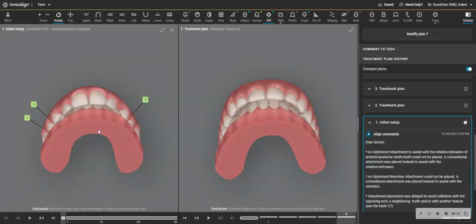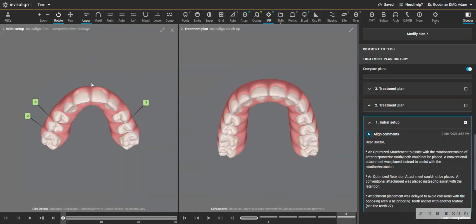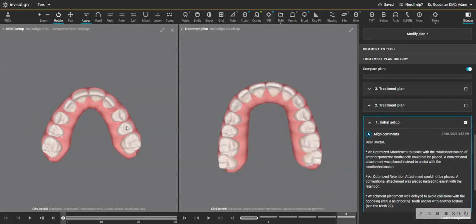I'd like to show you a case result that I think illustrates modern orthodontics when we're considering a full face, and also sometimes the simplicity of a treatment or the diagnosis. So I'm going to show you the upper teeth first. If you notice, here is how the patient started. We don't have to look at this yet, but this is the end result right over here.